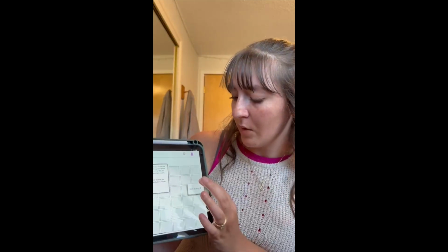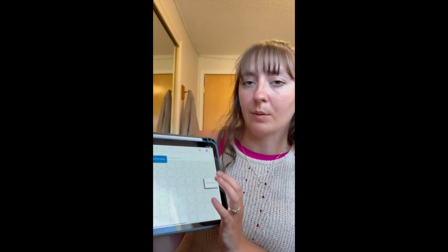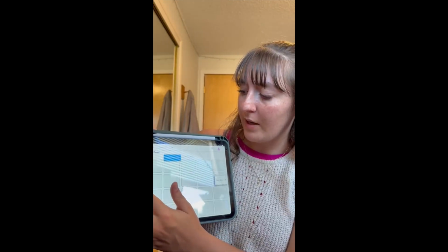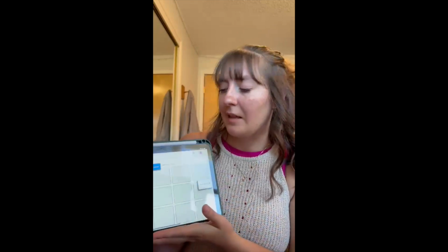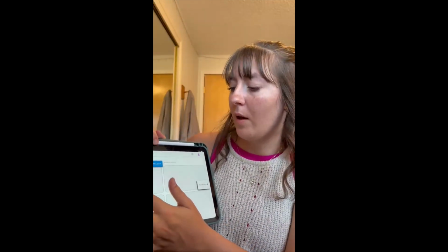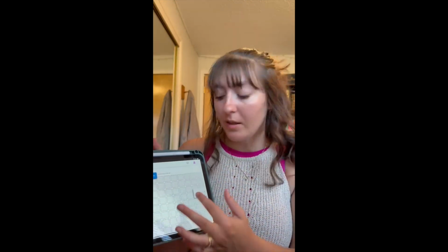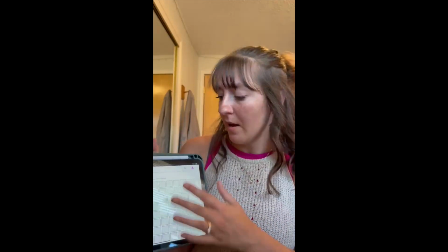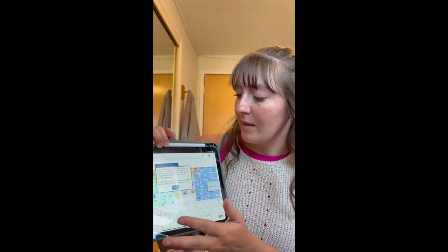And so then you can look and see, make the buttons bigger and smaller. So this is kind of giving you your size preference. So do you want more buttons on the screen? Do you want less buttons on the screen? And this can also be based on like the patient's vision or like their fine motor skills, things like that. And so you can alternate on this as well. And that doesn't mean that there's going to be less options. It just means that they're going to have more pages that they'll have to scroll through if they do have those bigger buttons. But for the sake of this, we're going to go with the smaller buttons. And then we'll hit select this layout.